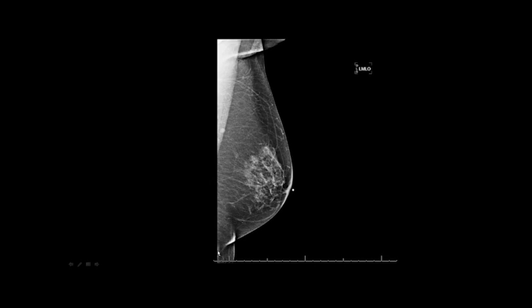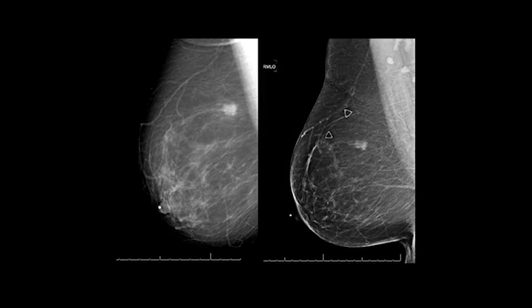Here's the IMF. It's clearly on there, but there's another fold down here. There's an air gap. You see this black air gap here? That means that the skin is not touching the detector when you see that. Nipples in profile. So yeah, this isn't the best to send in for accreditation.